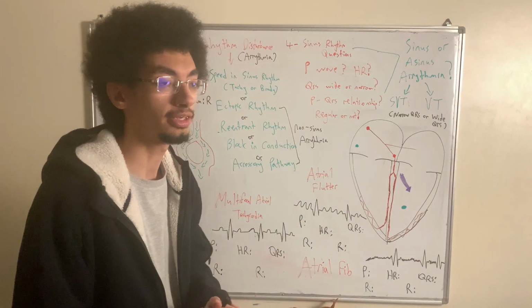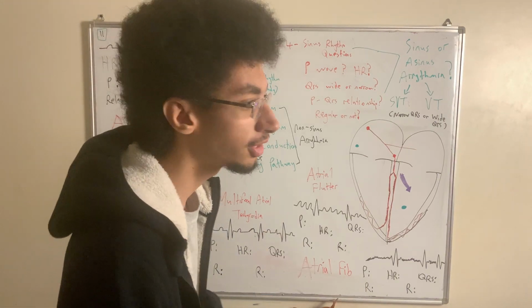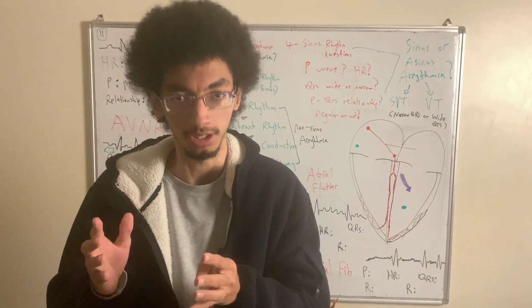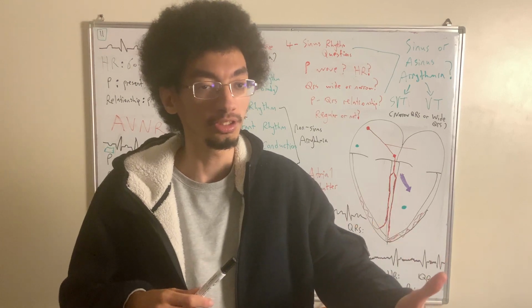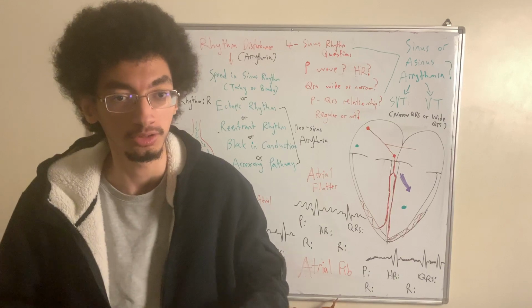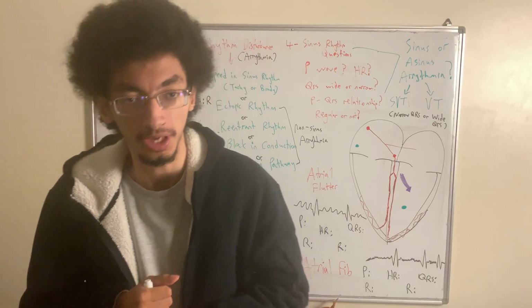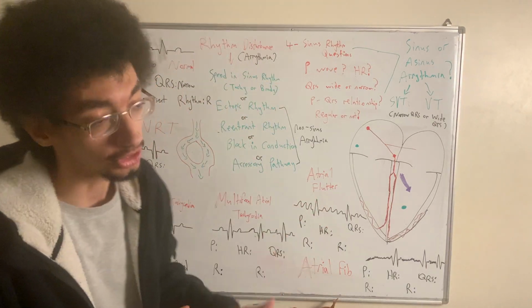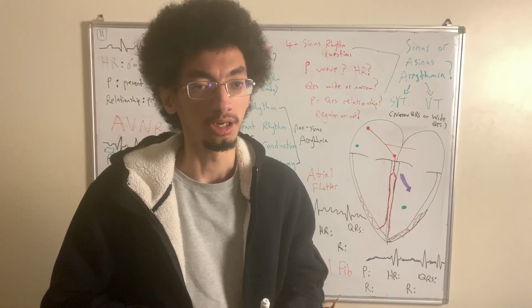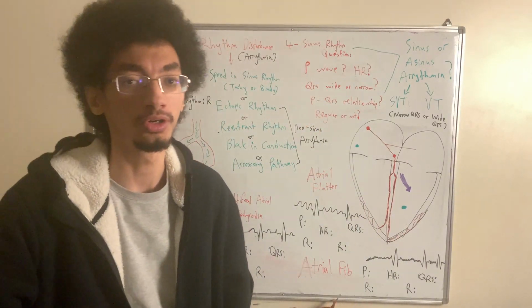In previous videos, we went to step number 7 immediately, where we assess for ventricular hypertrophy as well as atrial enlargement. We went to step 7 immediately because it's a lot easier to explain, and it was implementing some of the stuff that we were learning together up to that point. But now, this time, we're going to go in order. I've mentioned the first 3 steps: the heart rate, the intervals, and also the axis. So now we're going to go to step number 4.